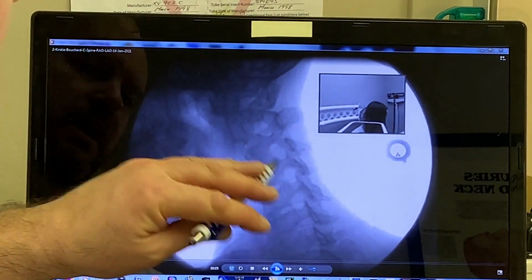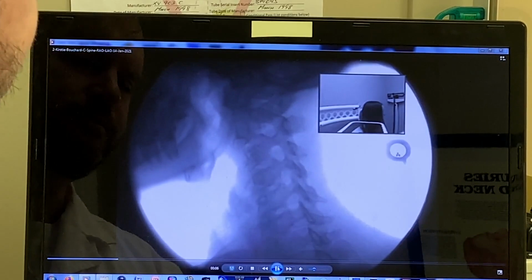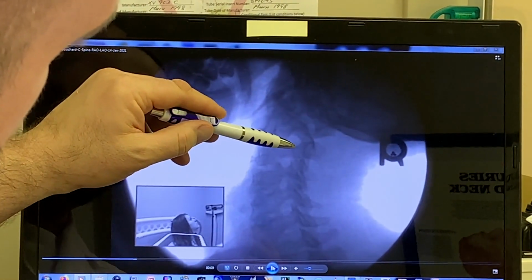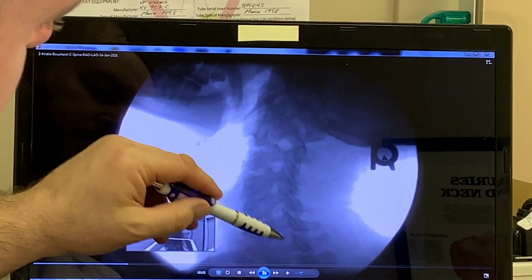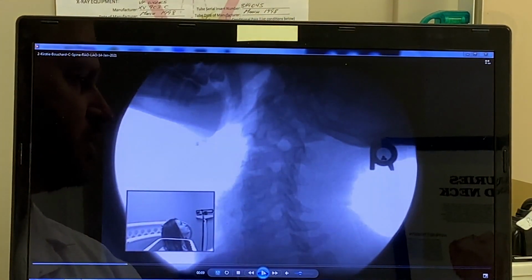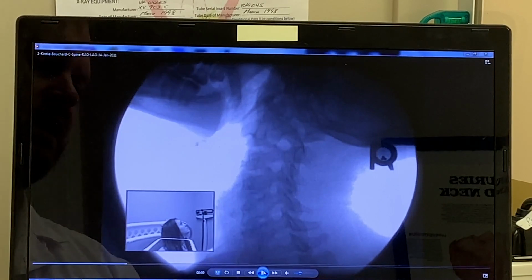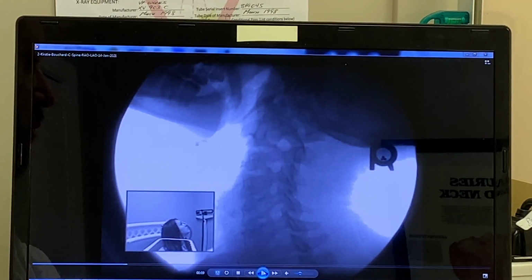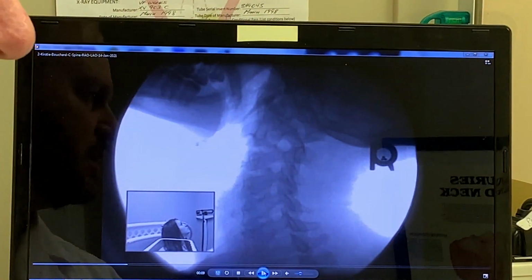So you can see how they all get bigger as you go forward. This is the right side of your neck, by the way. And then as you go back and close off, that one, and then this one indeed gets smaller, and then this one's bigger again, and that one's bigger again. So at this level, that opening closes more so than the other levels, which could pose the possibility that the nerve in there will get compressed a little bit in certain positions, but this does not look at the nerves. This just shows that there's a tendency that could be happening.